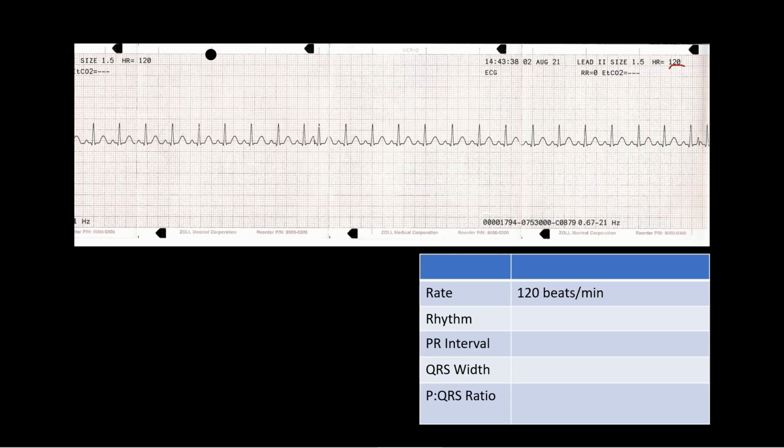Now, let's look at it. Does it appear pretty regular? Well, there is a funny little gap right here where it appears that it gets almost an extra beat in there. But besides that one extra beat, everything appears to march out pretty well throughout the whole strip. So I'd say that this is overall a fairly regular rhythm.